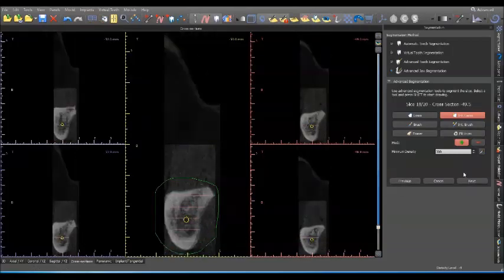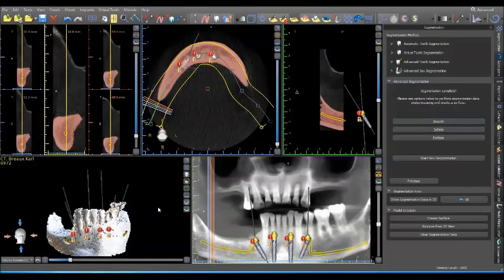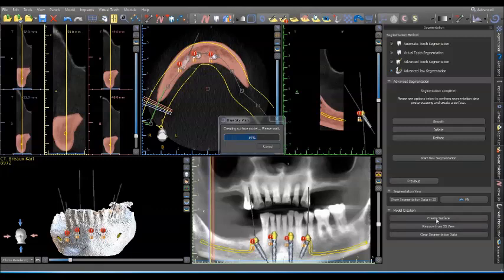So once it's all done, you'll get an image that looks something like this. You want to immediately save this. You don't want to lose any of this data. This is pretty much a large file. We're not done with creating the STL yet, but I definitely want to save what we've traced out. Once that's saved, I'll feel a little bit better. So what I'll do is press smooth, and then we'll actually inflate this just a hair. And then we'll go ahead and tell the software to create an STL surface of this model.